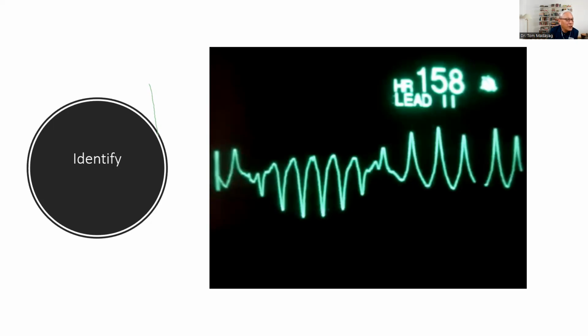Well, this is a ventricular tachycardia, the type that is called polymorphic ventricular tachycardia, better known as torsades de pointes. And torsades de pointes is a French term which means of different heights or of different points. This is exactly what is noted over here.